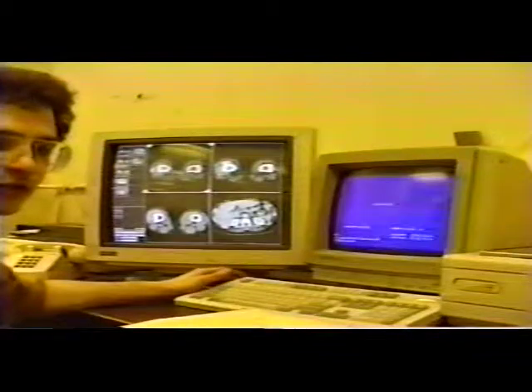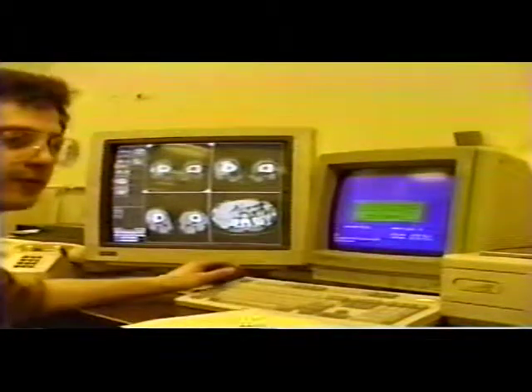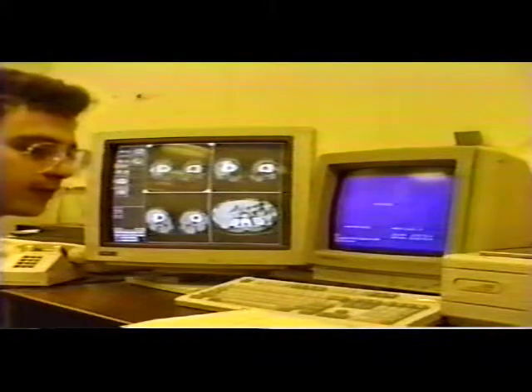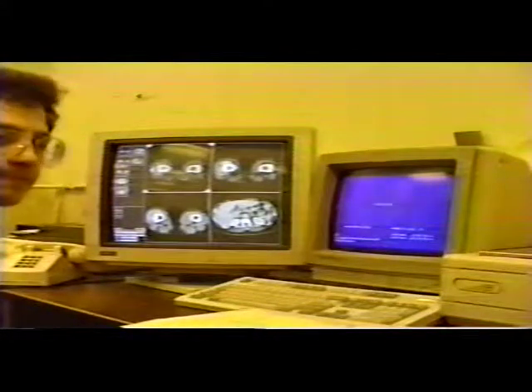We also have an integrated help system. At any time you can press the help key and get help specific to that part of the program. So that's the bulk of the system, and thank you for the time that you've given me.